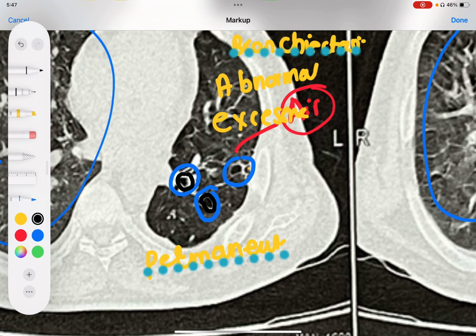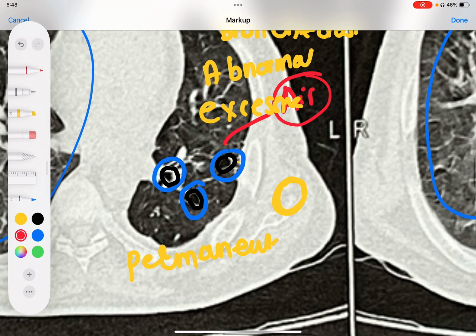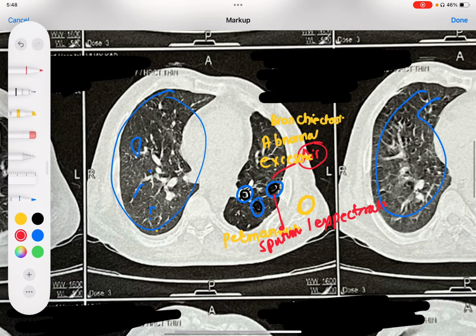They are so thick walled, and their integrity is lost, the elasticity is lost, so the bronchi become permanently dilated, and these bronchi fail to throw out the secretions which are there. So these patients keep on getting recurrent lung infections, and these dilated bronchi very commonly have sputum, expectoration, mucus secretions, and recurrent bacterial as well as viral infections.